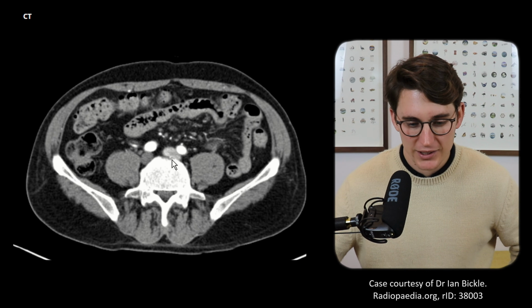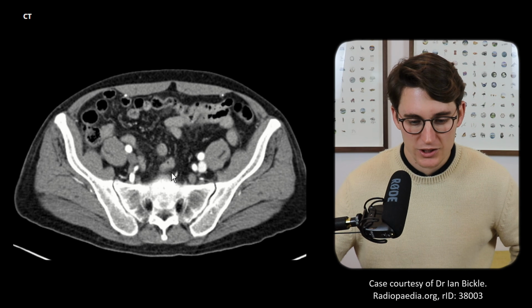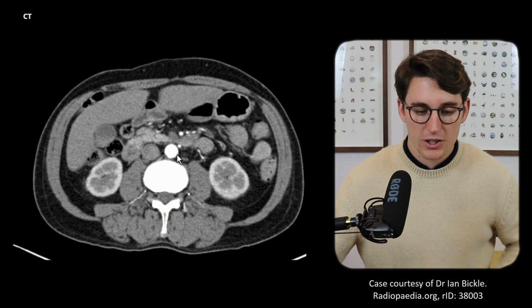We can follow that median sacral artery down into the pelvis, and those are going to supply our sacrum as well as sometimes giving off a little bit to our superior rectum. So I hope that helps.